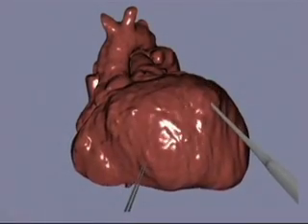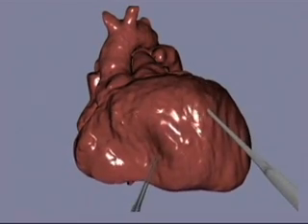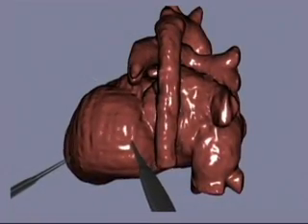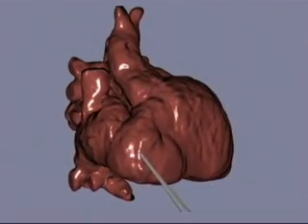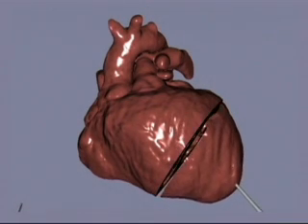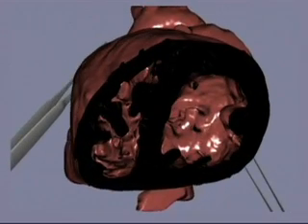A real-time cardiac surgery simulator was recently developed. It allows pediatric cardiac surgeons to evaluate different surgical strategies preoperatively. In the remainder of this movie, we will be watching annotated simulations of several surgical strategies and explorations. The goal is to determine the optimal incision points to allow the surgeon to reach in and close the two septal defects.